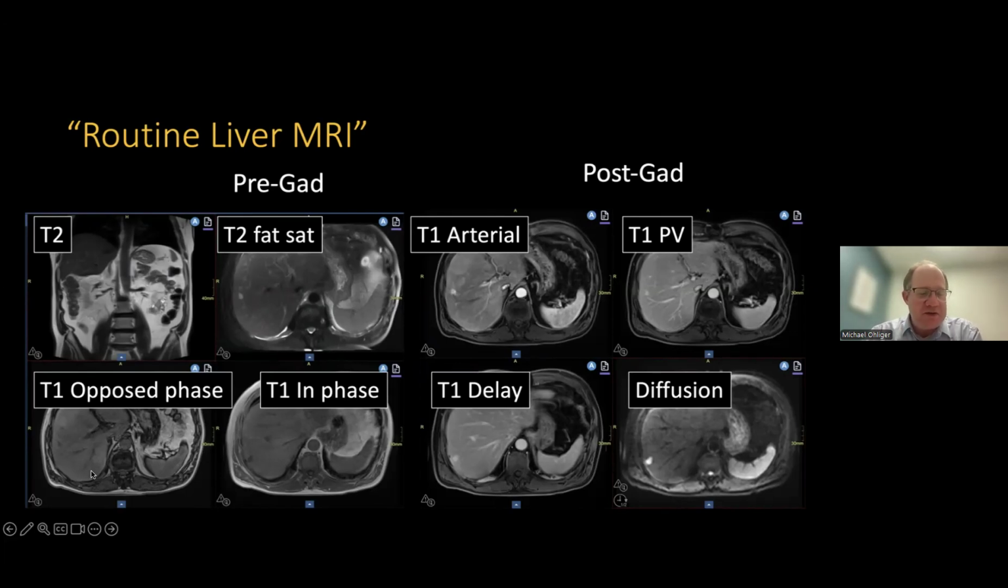There's another one which is part of another lecture, which is what's called a T1 weighted image. Now, the T1 is used for 2 things in the abdomen. The first thing, which I'll get to afterwards, and that's the obvious thing, is I actually can look at how things enhance with contrast. So if you have tumors or lesions or vessels or anything, and I give contrast and I want to see how they light up, that's going to be T1 weighted imaging.